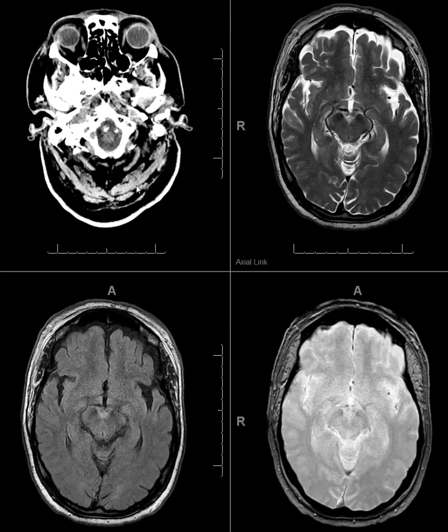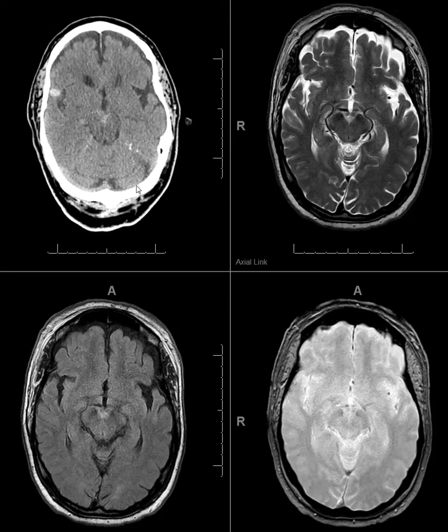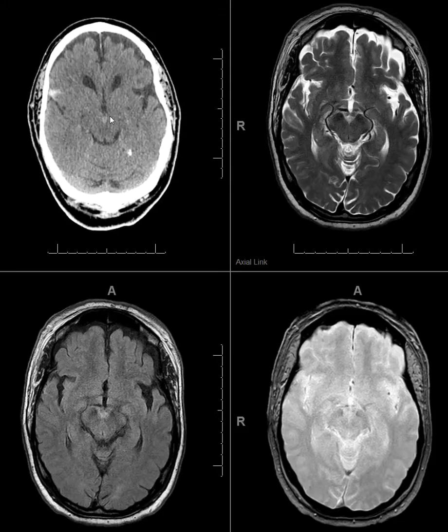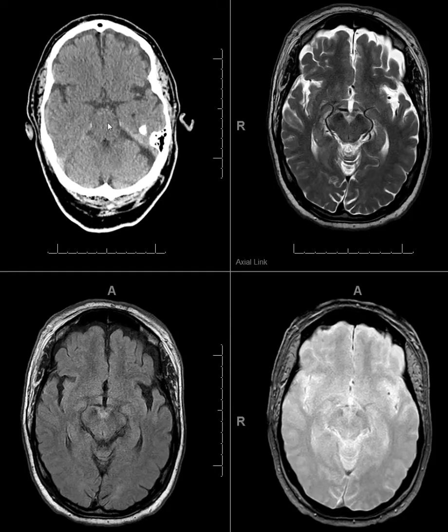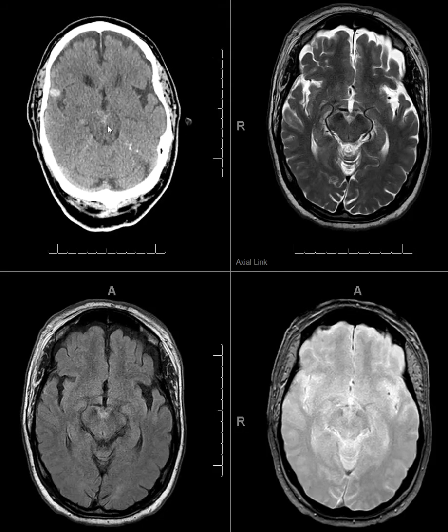This is an 80-year-old male with closed head injury with loss of consciousness earlier in 2017. The CT was done and showed hemorrhage within the sylvian fissure and within the prepontine region, dense in the sylvian fissure region, and relatively faint blood as compared to the other one in the prepontine region.